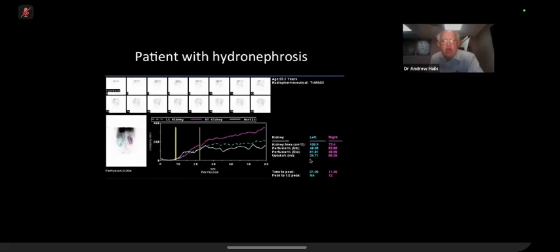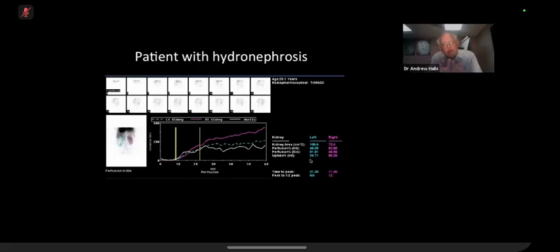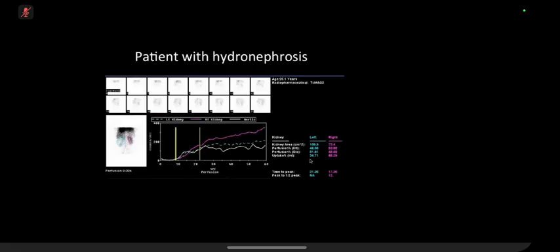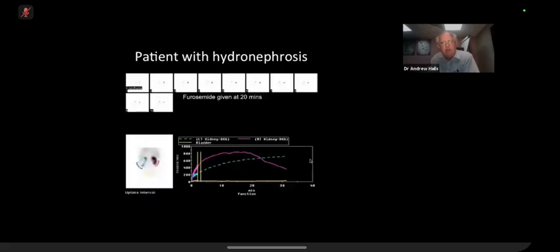It might seem, so this is in seconds. I know that if you have a hydronephrotic kidney, if you look at it in terms of minutes, you'll get build up in the kidney, won't you? As we'll see in a minute. But when you have the perfusion phase, which this is, the obstruction produces a lower curve, decreased perfusion.